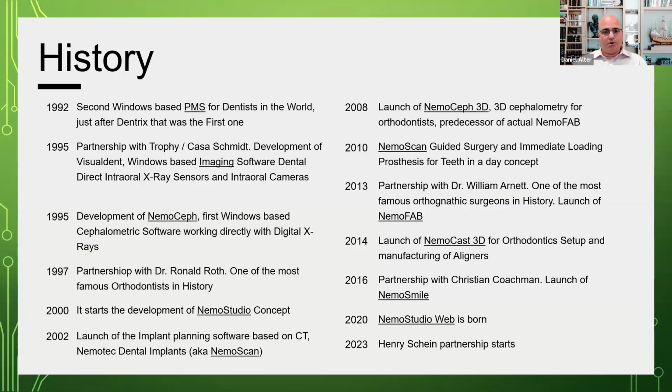So with that said, as we go through this, I'll share with you the different modules that come with the software. Hopefully by the end of this hour, and I'm incredibly grateful for the hour that you share with us, I'll be able to show you all the different opportunities that are available for you. Each laboratory may have a different pathway or a different journey through this, and it could really satisfy many different products as well as solutions for your laboratory and ultimately your clinicians. And the benefactor of this, which should always be, is the dental patient ultimately.